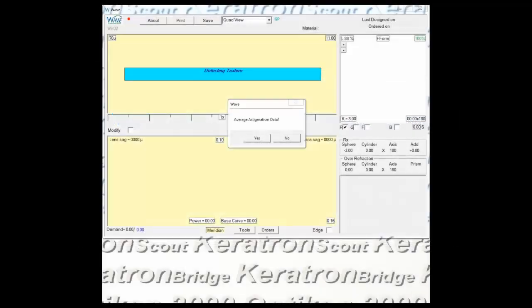In this segment, we're moving into actual lens design. The design process for VST OrthoK is pretty straightforward because a great majority of the patient analysis is done prior to this step. We've already evaluated quality of baseline topographies, selected a best map for editing, measured HVID for overall diameter determination, and then looked at the elevation map to decide whether we're using an RSIM, GSIM, or freeform design.